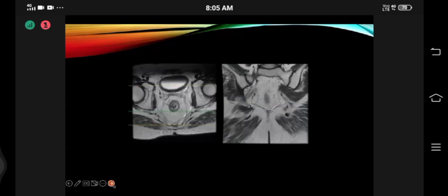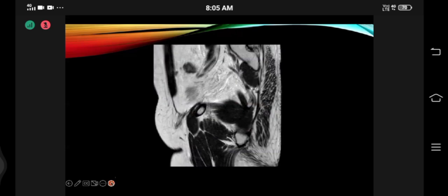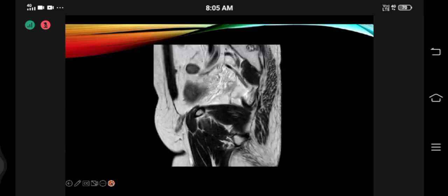Yeah, the same sciatic nerve. Sorry, it's slightly taking time to load. I hope this is not extensive. I mean, these are the basic anatomic landmarks which you have to see.